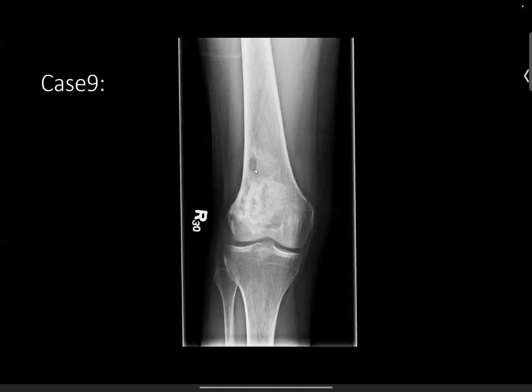That's why I was saying just ignore this little finding here. This lesion here is a very ill-defined sclerotic lesion, and so that's not what a NOF would look like. NOF is going to be a bubbly, lucent lesion with a sclerotic rim. So this is an osteoid-producing lesion that's ill-defined. You hear yourself saying ill-defined, and you want to think malignant.